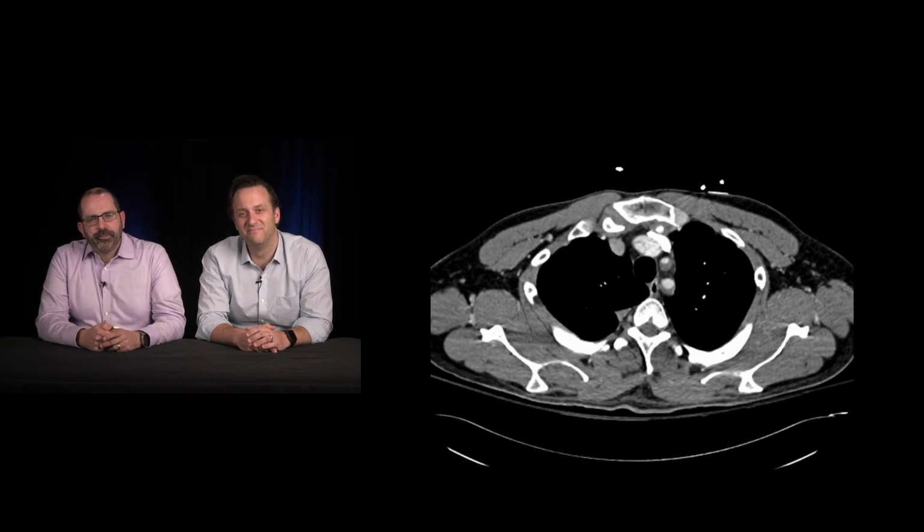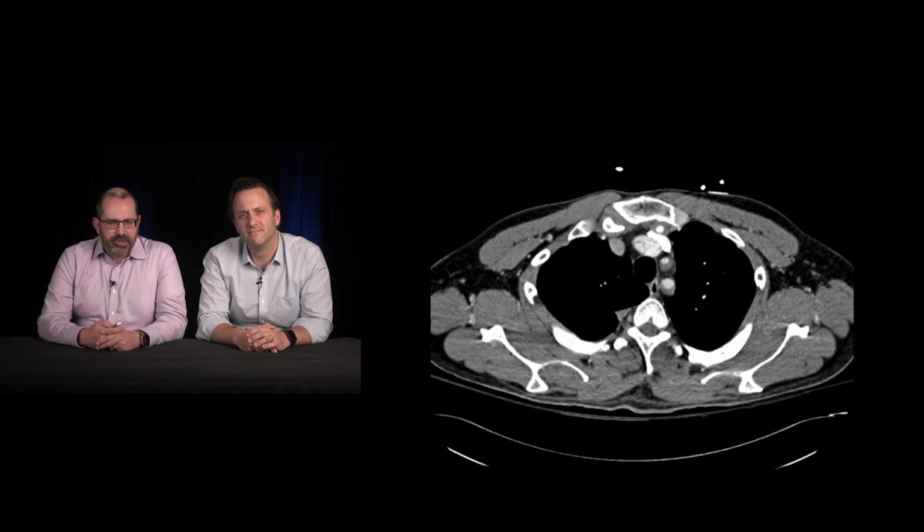All right. So here we go. This guy comes in with chest pain. He doesn't look great. Okay. So automatically, you know, your spidey sense is going off.